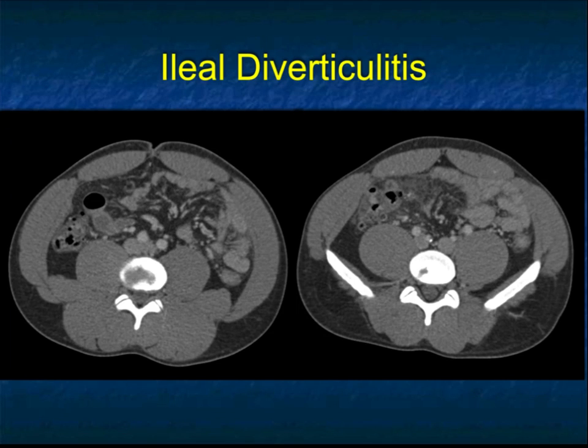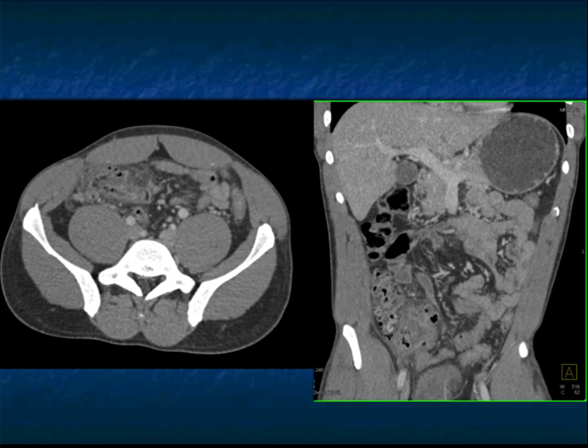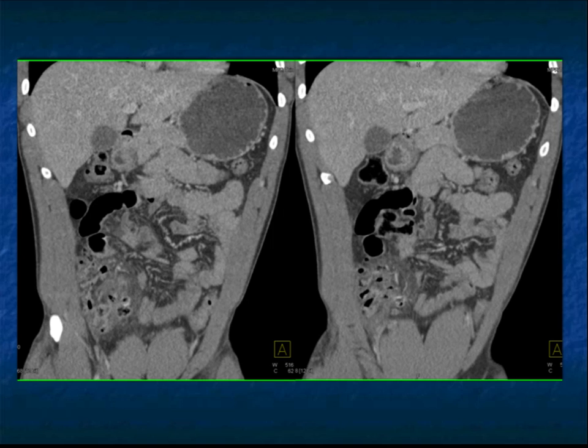And here's a very nice example of ileal diverticulitis. Again, you could think about something like Crohn's, you could think about other inflammatory processes, missed appendicitis, Meckel's diverticulitis, but you can see the multiple diverticuli here, and then you realize you're talking about small bowel. You're not talking about the cecum, because you can get cecal or right-sided diverticulitis, and this diverticulitis involves the terminal ileum. Again, you recognize the inflammatory process. The key is to recognize that it's diverticulitis of the small bowel. Just really a nice example.